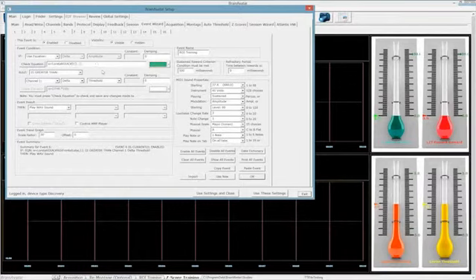As opposed to choosing a specific ROI, if I type in select ROI, this feature is going to work with a special function. I can also, as opposed to choosing a specific band, type in select band.